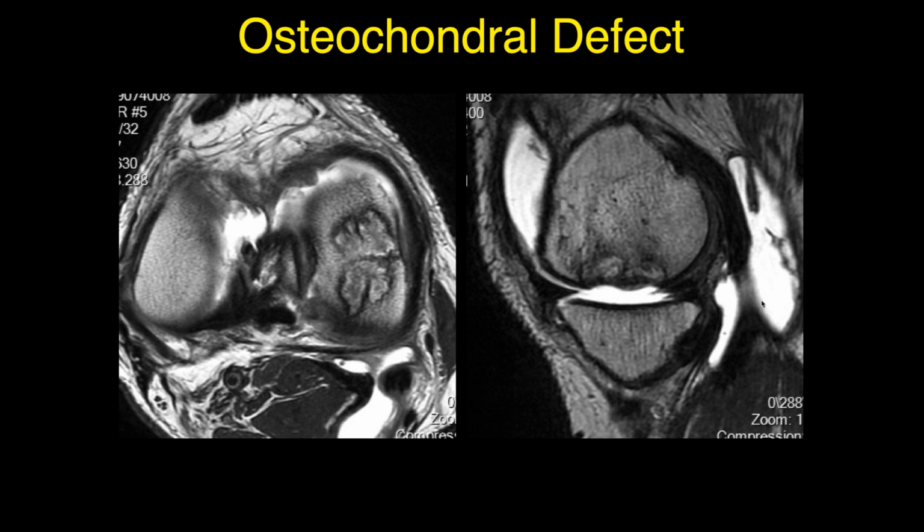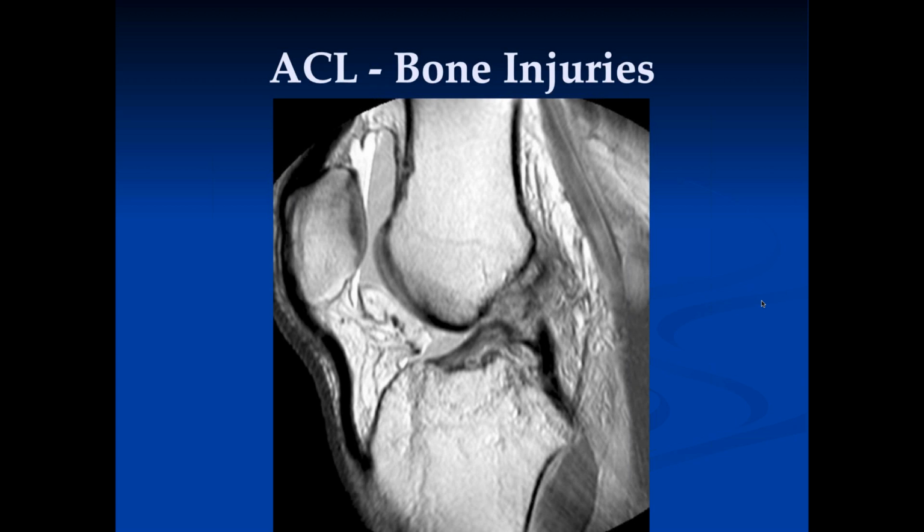And you can do osteochondral grafts in a situation like this, or medial resurfacing techniques. So a number of possibilities here. Do we have an age on this, John?